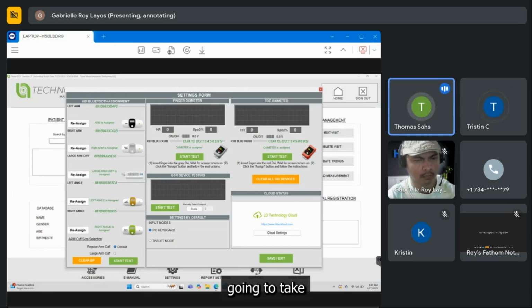Okay. And I'm going to take your word for it that all of the cables are plugged in correctly. If there's any doubt on that, then we would do the GSR device testing, which is when we attach the electrodes to your hand and run that, and that establishes the actual connections there. But I remember us doing it last time. If you haven't changed it, then we should be fine. Okay. So go ahead and hit save and exit.